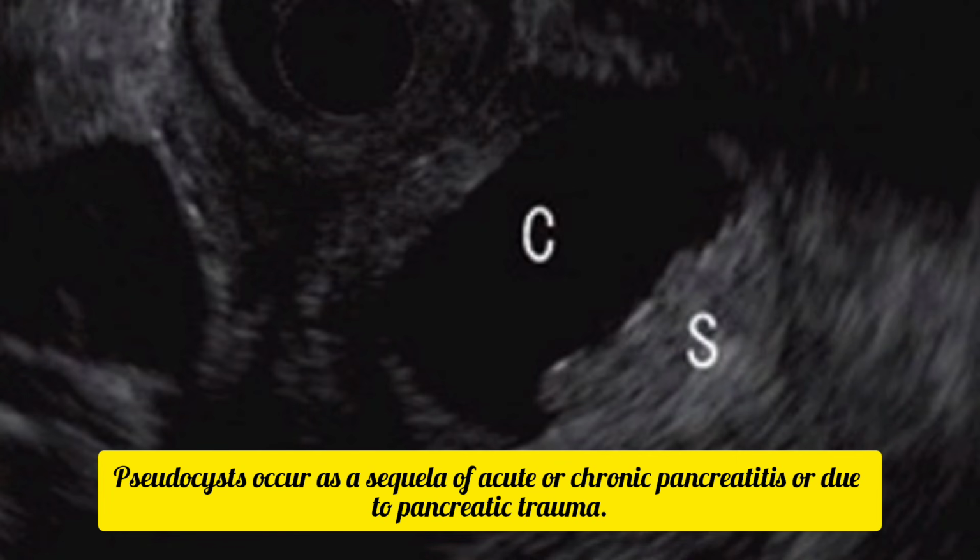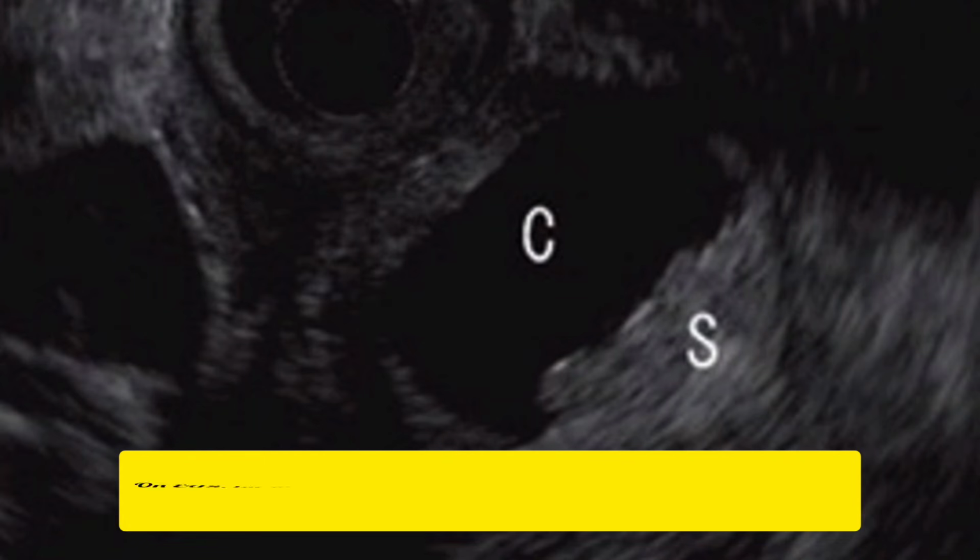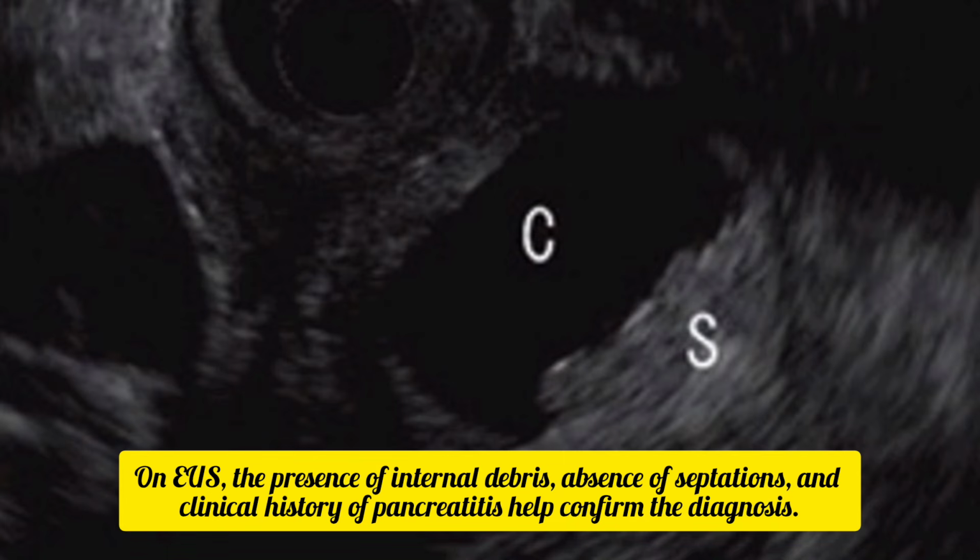Pseudocysts occur as a sequela of acute or chronic pancreatitis or due to pancreatic trauma. They represent collections of pancreatic fluid surrounded by fibrous tissue, not a true epithelial cyst. On EUS, the presence of internal debris, absence of septations, and clinical history of pancreatitis help confirm the diagnosis.